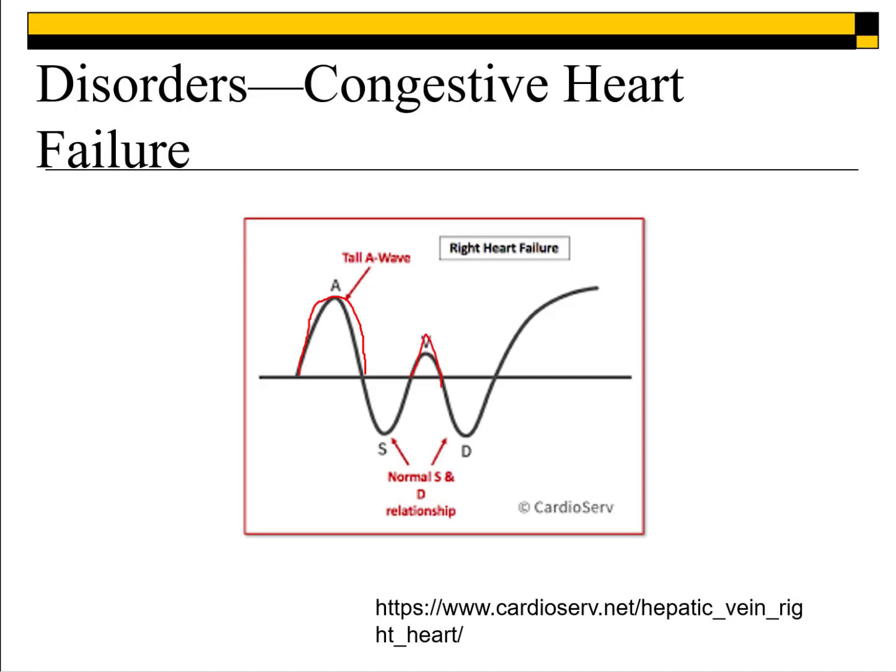Our S wave, as the heart failure gets more severe, will start decreasing in size, similar to our early stages of TR. So as you can see, it's problematic in those early stages to differentiate the two, congestive heart failure or TR. So that's why you just think of those two entities when you start getting this decrease in S wave compared to our D wave ratio. Now, in the end, the main takeaway here is if there is a retrograde S wave, right, then we know at least some TR must be present.